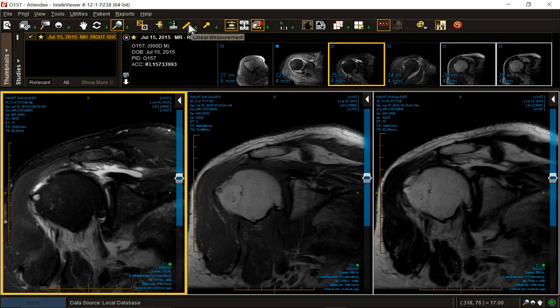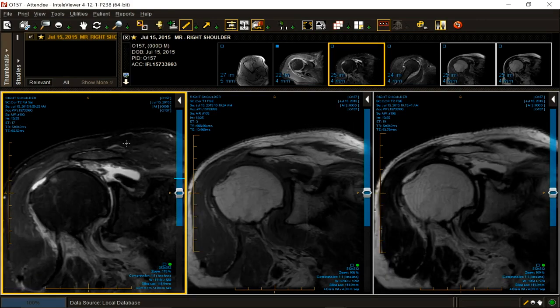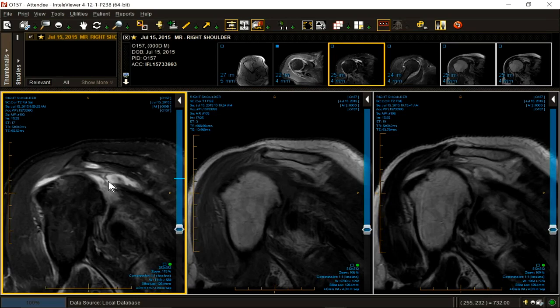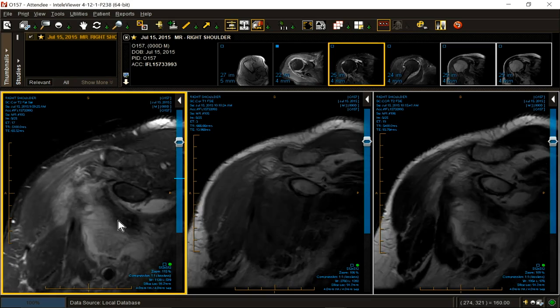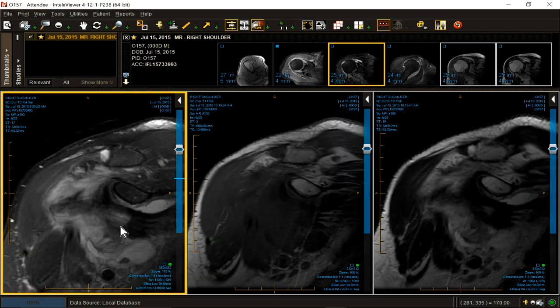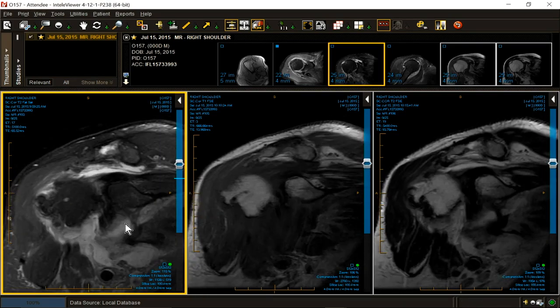We have a medial lateral dimension of the tear that is 5.5 centimeters. Add a centimeter because it's curved. So 6.5 centimeters of retraction. Or said another way, retract it to the AC joint. The infraspinatus, same thing. Subscapularis, same thing. Upper fibers, middle fibers, lower fibers, they're all off. There's a big hole in the middle of the subscapularis. You were asking about subscap tears earlier. This one is ruptured.